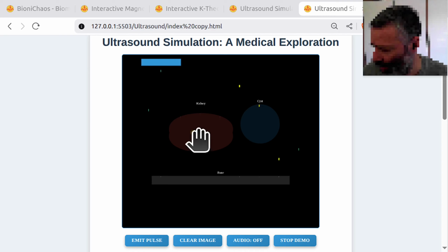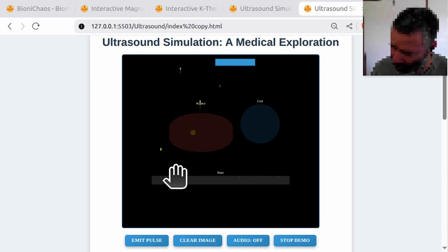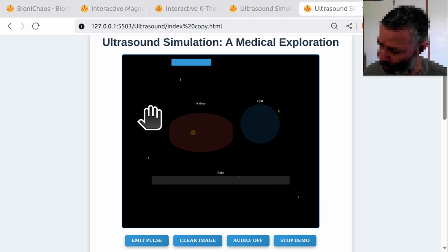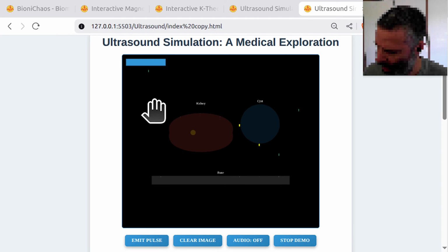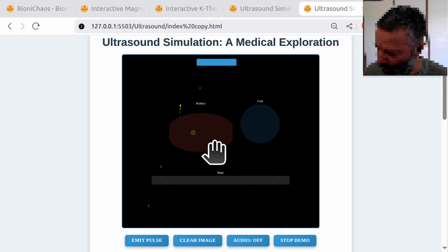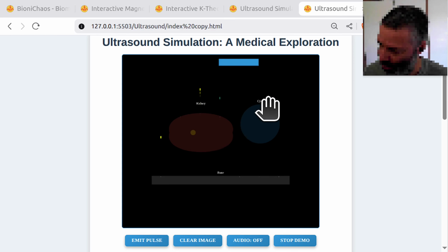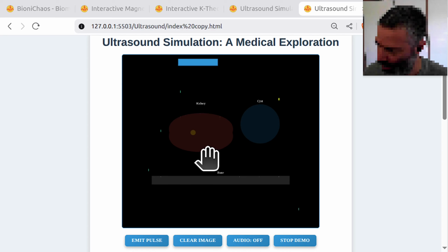I didn't quite get what we're trying to do. I thought there would be another inset with the reproduced image from the scan, but it seems like the whole thing was just grayed out. Is it meant to be gradually returned to its original colors or something as the scanning progresses?